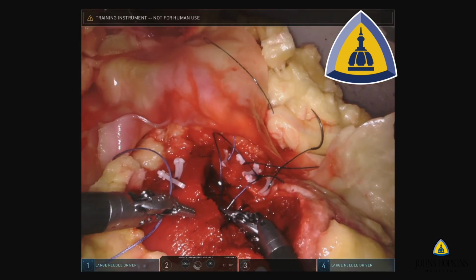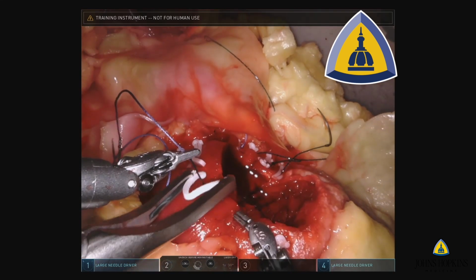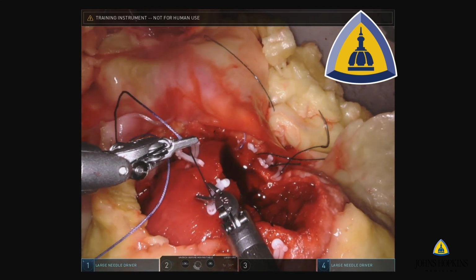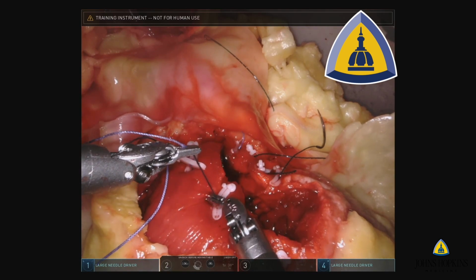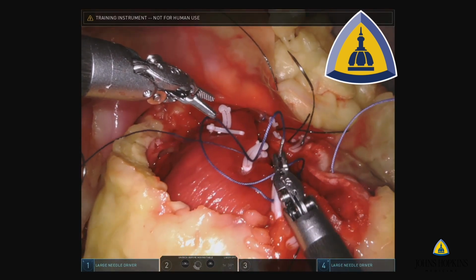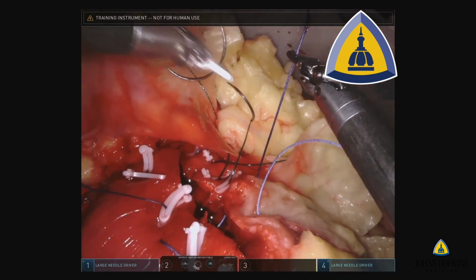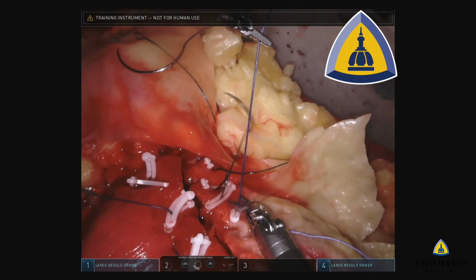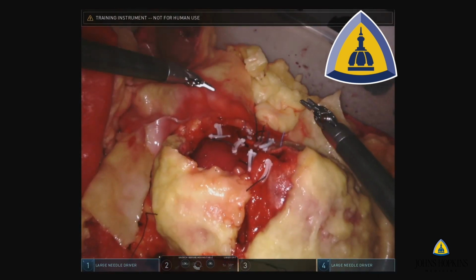We were very keen to replicate the mechanical properties of the kidney tissue. We did a special test to make sure that no excessive force would be used during this sliding clip renorrhaphy technique, because we don't want to teach them to put excessive force on this part, ripping out the parenchyma, but at the same time, adequate force to compress the parenchyma. So at the end of the procedure, there is good coaptation of the parenchyma, and you can measure positive margins, ischemia time, as well as blood loss.